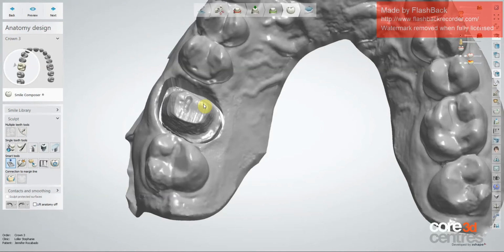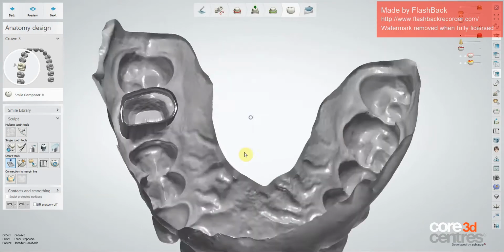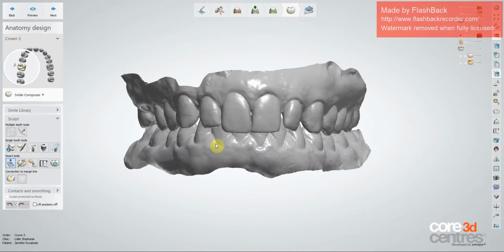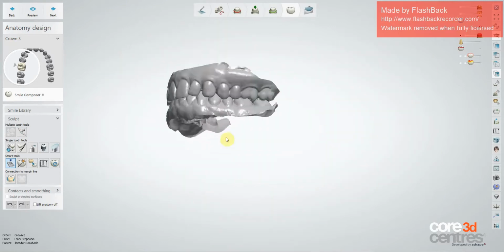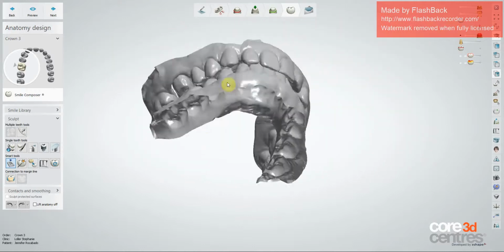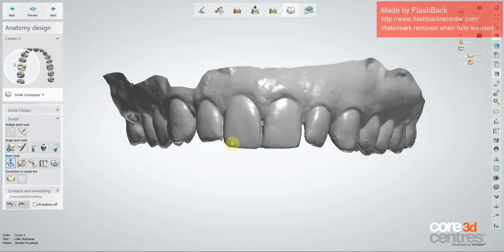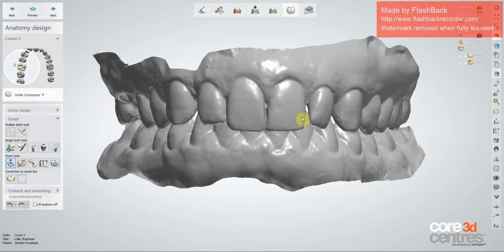There's a few things I want to show you here. There's a lot of time savers built into the software that not a lot of people use. One of them is the very first thing I do, which I've got pre-programmed in my mouse. We spend the majority of our world trying to do this, and then you do something and then you try and get back to that one spot. So why not set a spot, a pre-programmed view?